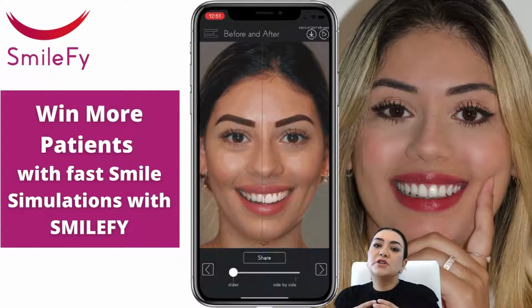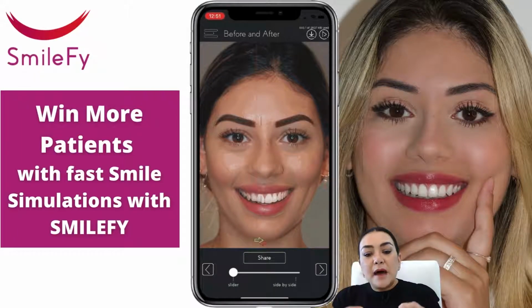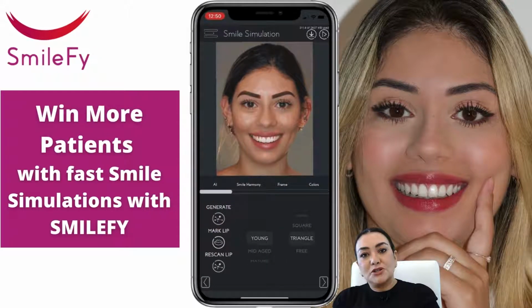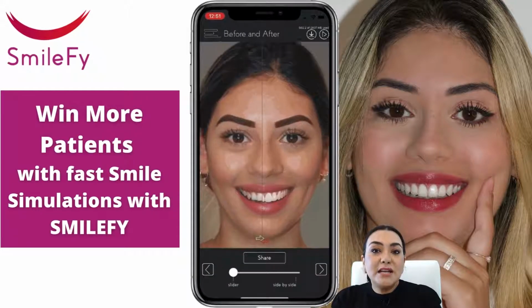So I want to bring something new for you today, something that is very innovative, something that is easier, and we have artificial intelligence in it. SmileFy is a software that helps you to win patients with fast smile simulations. So I will show you what you need to get started.